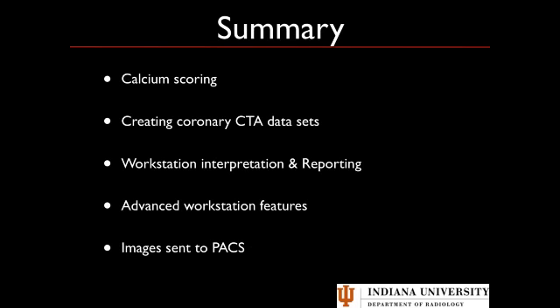So again, as a summary, we talked about calcium scoring, how you load it in and score that. Basically, that's really a see one, do one, teach one. Talked about the coronary CTA data sets that you're going to create. That's very important so that you can load them into the workstation and actually do your interactive interpretation using MPRs, and then do your reporting, making sure you talk about what the plaque characterization is and the effect on the lumen. And then we talked about advanced workstation features.